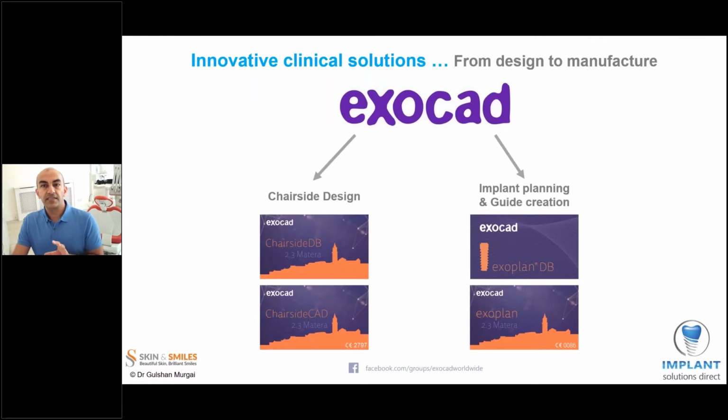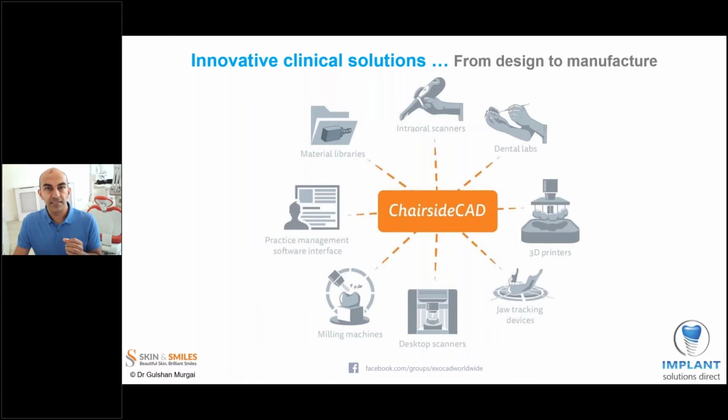Now let's look at exocad and the 2 out of their 3 product platforms that we are looking at. We're going to look today at chairside design, so that's ChairsideCAD, and we're also going to look at exoplan. Exoplan is the implant planning and surgical guide design software, and we're going to look at both of those today. We're going to start by discussing ChairsideCAD.